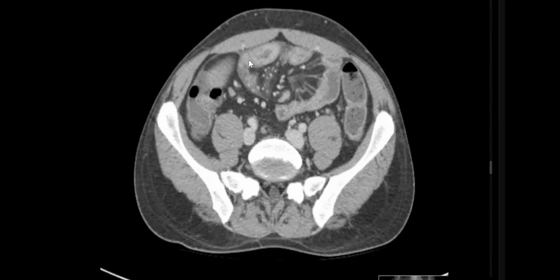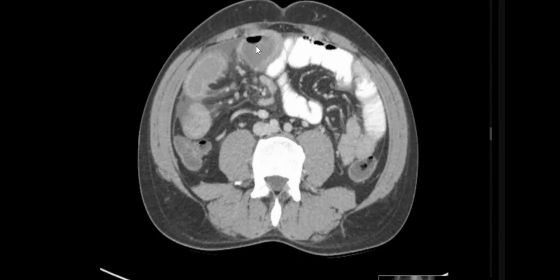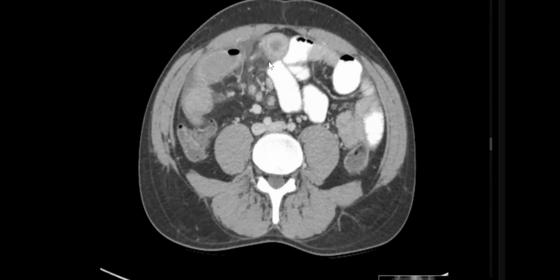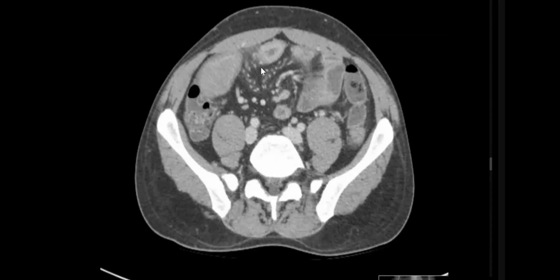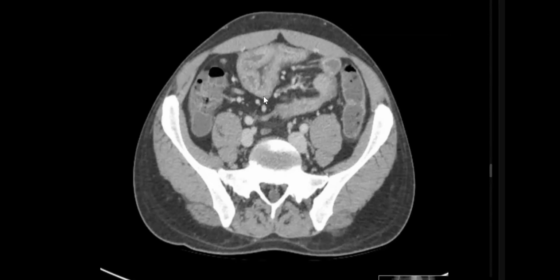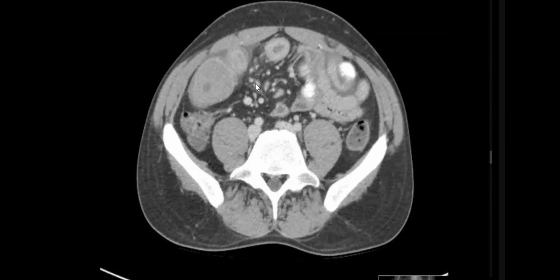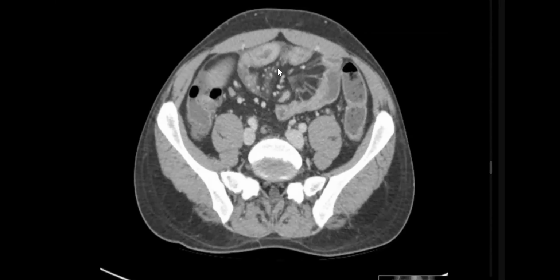I'll guide you. So you detected an area of mural thickening, collapsed bowel, followed by a proximal obstruction and dilatation of the proximal upstream. So this is the transition point, which is inflammatory, no mass. It's hyper enhancing and there is a comb sign, sometimes associated with a few small lymphadenopathy.